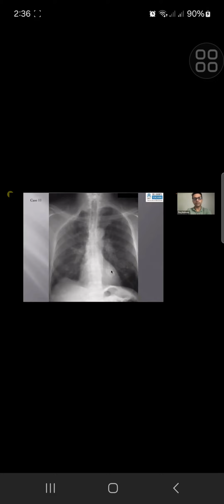So review areas. So that's a nodule there. And the right chest, as you said, is a bit deformed. It can be previous surgery. It can be previous surgery for cancer on the right side, in which case this can be metastasis. Yeah. Is that okay? Does that make sense? Yes. Thank you. Good. Excellent.